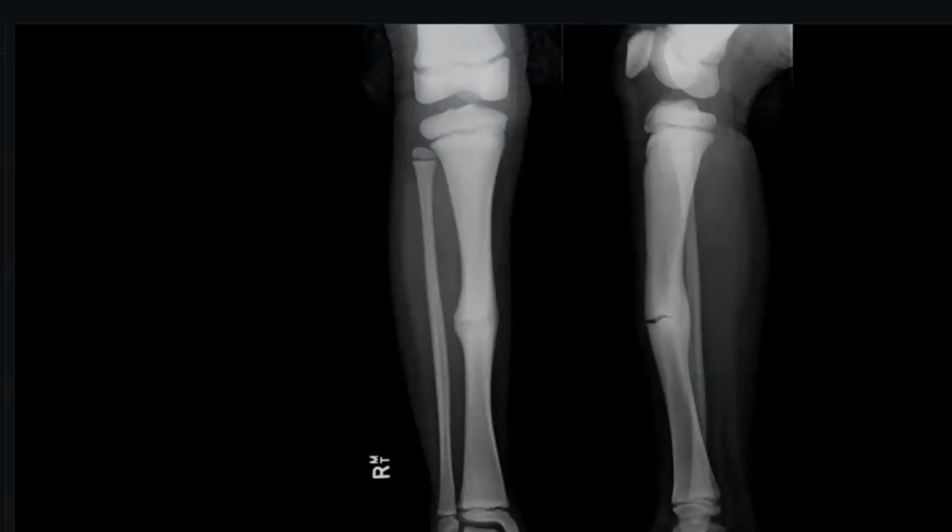This is frontal and lateral views of the right leg showing tibia and fibula of the same patient, in which I can appreciate a diffuse bony sclerosis of all the bones. Also, the mid shaft of the tibia is showing a lucency within its center, which is partially united with adjacent osseous deposits, giving the periosteal appearance, likely due to a callus formation due to some recent fracture. The fracture looks incomplete, and looks like a type of insufficiency fracture or a Looser zone.